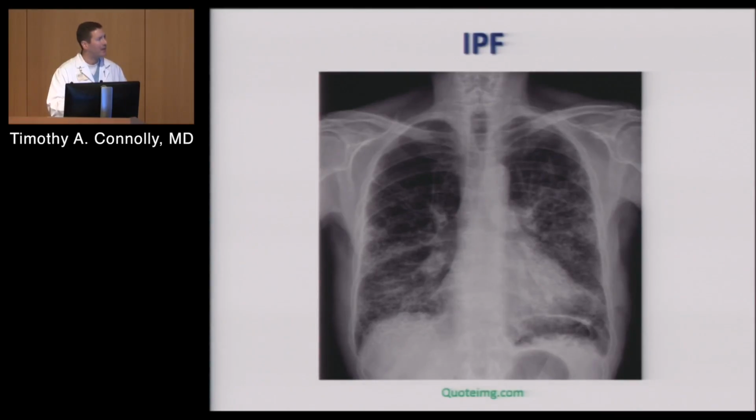This is definitely very different. And if you look here, you don't see an ounce of pleural effusion either side, but you see a lot of haziness down here. If you had enough pulmonary edema to give that pattern, you're going to have fluid in the pleural spaces as well. So that's something as a trigger for you to be thinking.